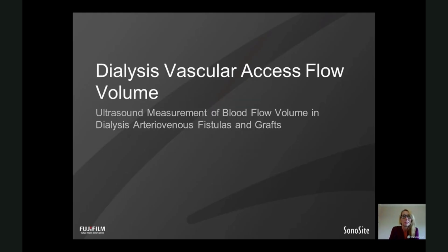I'm going to be talking to you today about using ultrasound measurement of blood flow volume in dialysis arteriovenous fistulas and grafts.